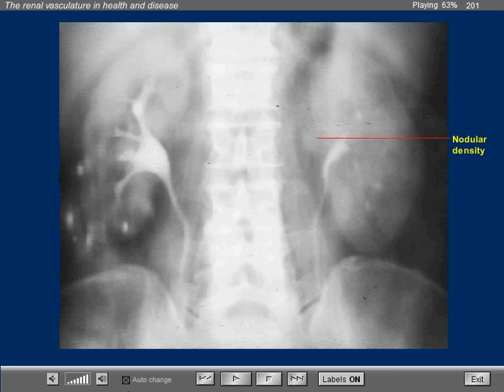Adenopathy might be a possibility. Another one that we might see is a vessel in this region. It could have been also a small tumor.